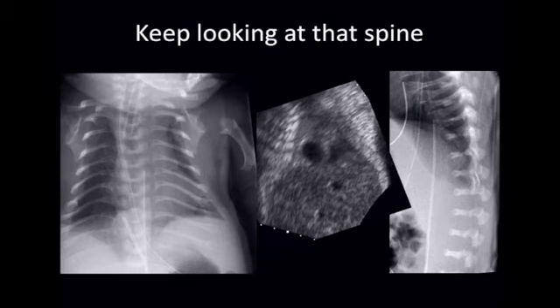And the way to think about that, again, is to keep looking at that spine. So here's a neonatal chest x-ray and a neonatal spine on either side of a coronal fetal ultrasound. This is the fetal abdomen here from side to side. And you can see that the chest is tiny, and the heart actually takes up the chest from side wall to side wall. Looking at your x-ray again, you have that small chest appearance.